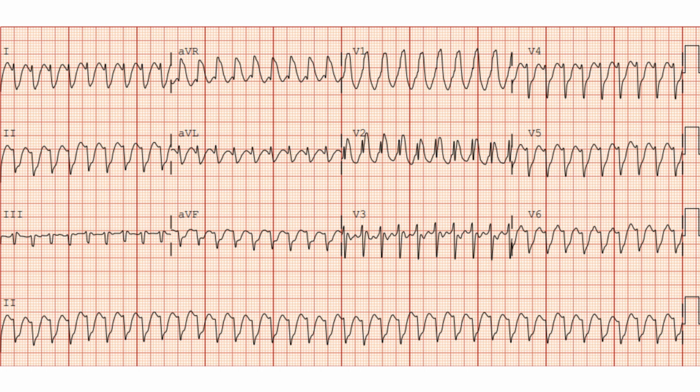We'll talk about some of these EKG tips to differentiate between the two, but in my opinion, it doesn't matter. When you see a wide complex tachycardia, the first question is, are they stable or unstable? If they're unstable, you use electricity. If they're stable, you can reach for medications, okay? So the EKG findings on here, which do favor ventricular tachycardia, there are many of them. Like most of this EKG looks like VTach except for one finding. We'll talk about that in a little bit.